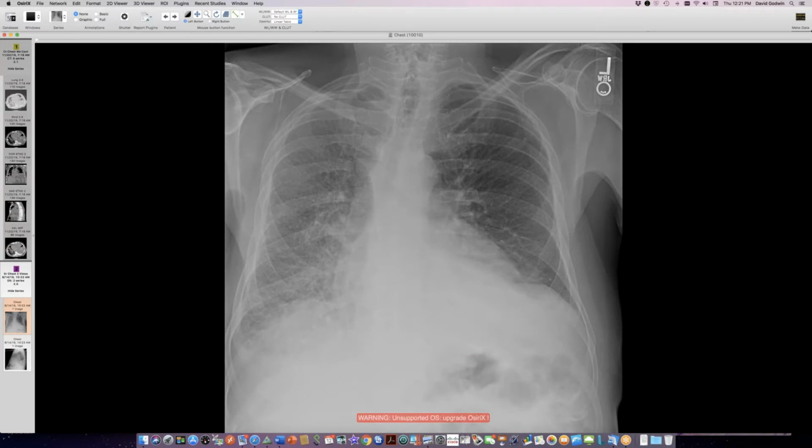So here's a person with an asymmetric pattern of septal lines. We have lots of septal lines here on the right. We have accompanying pleural effusion. And we have relatively few on the left. So it's really way asymmetric. So I was looking at this radiograph and said, it would be very unusual for edema to be the cause of such an asymmetric pattern here. I thought, you know, could this be mitral regurg with a jet directed to the right? But that's usually more localized in mid and upper lung and not really so diffuse here.